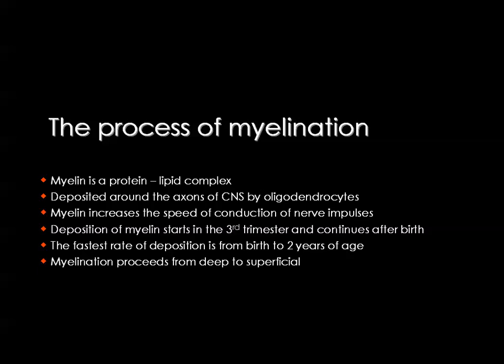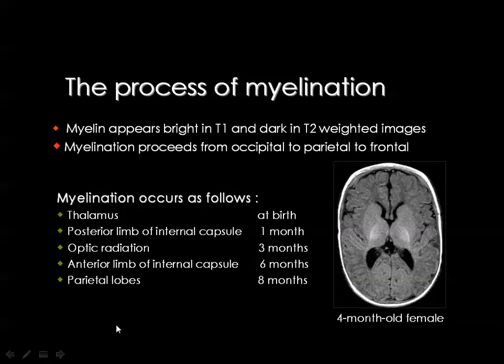white matter. So in the fetal brain the white matter contains a lot of water, and before delivery the brain starts to deposit myelin instead of water in the white matter. Then you know that water is black in the T1 and bright in the T2, while fat is the opposite.